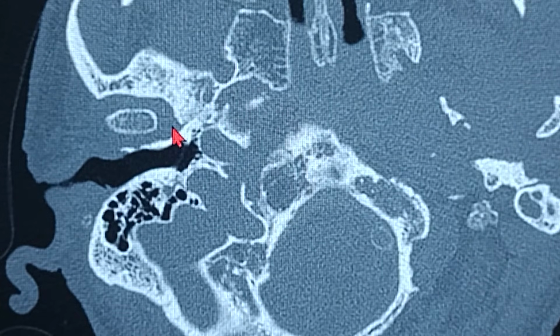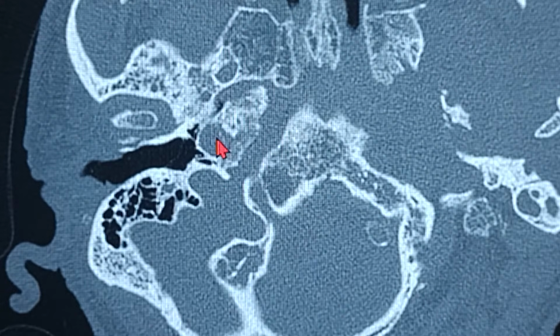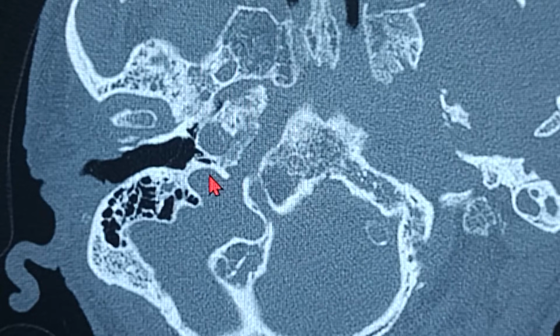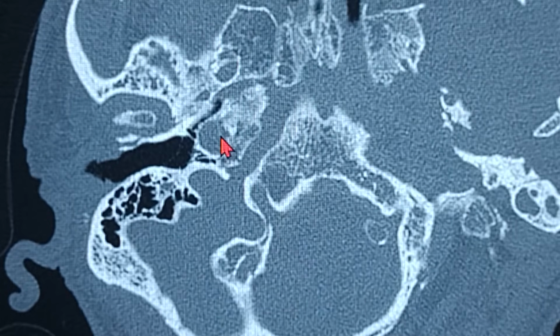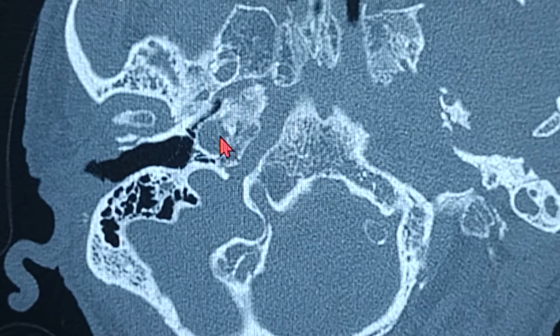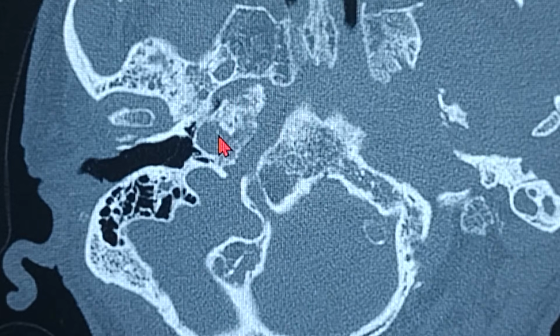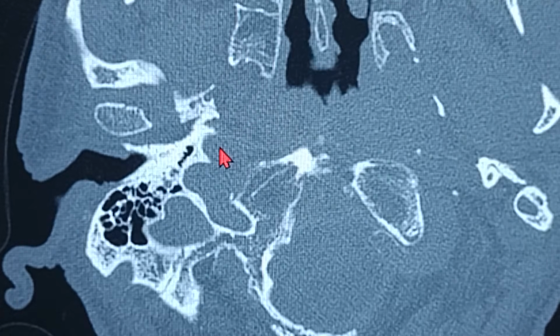That's the mandibular joint over here. So I'm going to go above. Keep your attention on the internal carotid artery, and then later on the IJV. So now I'm going to show you 3 to 4 structures more, keeping the internal carotid artery as the landmark. So as you can see, the course of the internal carotid artery is changing here. So I'm going to show you the course of the artery.